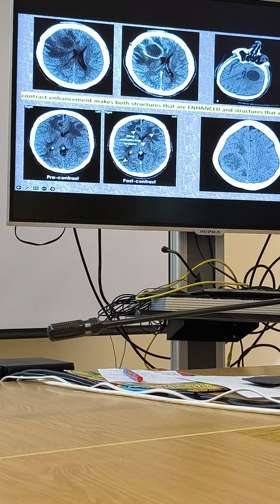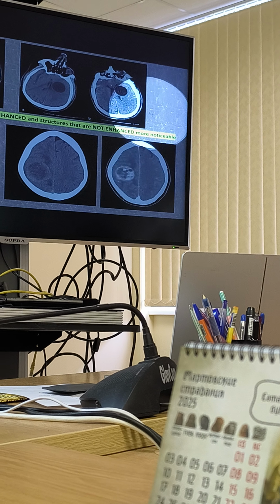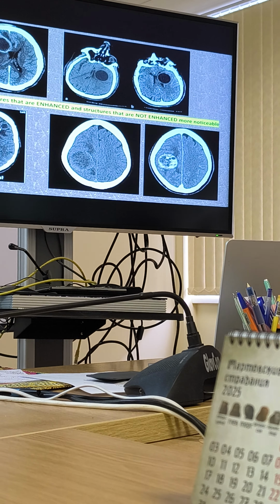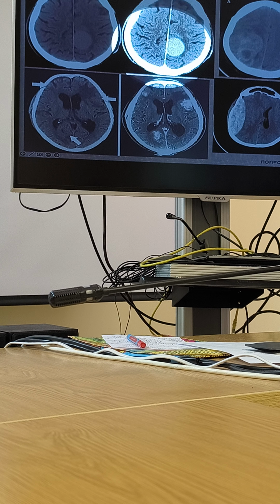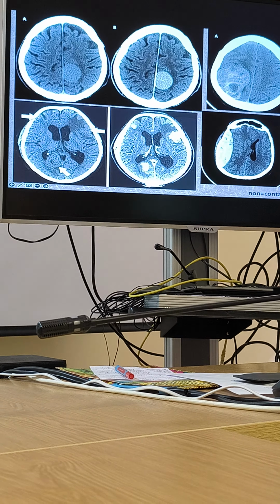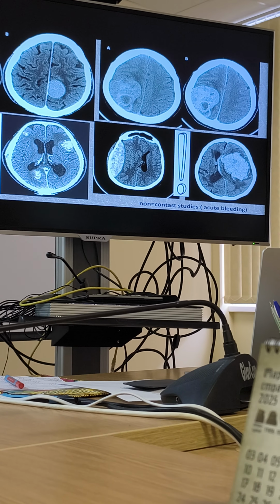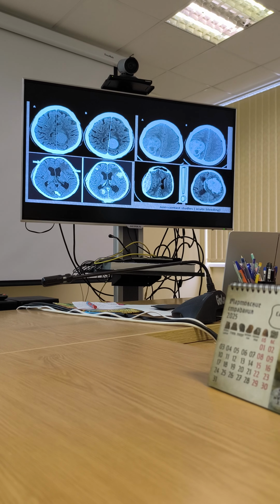It's here, yes. And if you look at this pair of pictures, it's brighter there. And even here, and if you compare this pair of pictures, where do you see it in bigger detail? There. And again, where? Yeah, and the same thing there. Every time when we compare a pair of pictures without contrast and with contrast, it works. We see it in better detail.